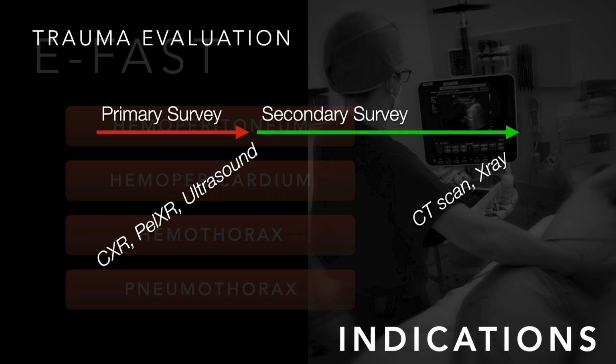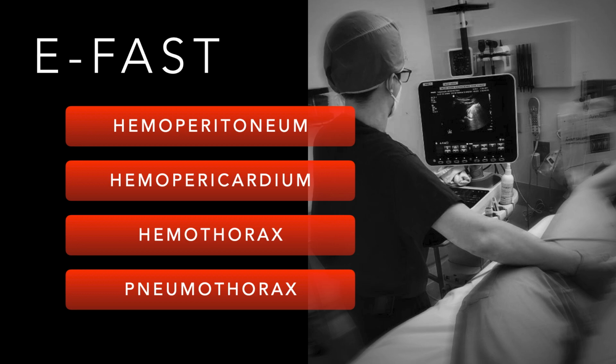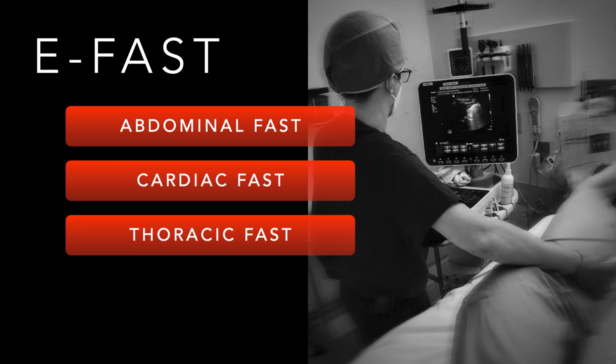But we said, hey, we're looking for a number of things, right? We're looking for hemoperitoneum, hemopericardium, hemothorax, and even pneumothorax. And we can utilize this set of questions that we're trying to answer to look at the different components of the FAST exam. So the hemoperitoneum is covered in the abdominal FAST, hemopericardium is covered in the cardiac FAST, right? And we also look at a little bit about global function, which we talked about last week. And then today we're going to talk a little bit about how we can use the thoracic portion of the FAST to look for hemothorax and pneumothorax.